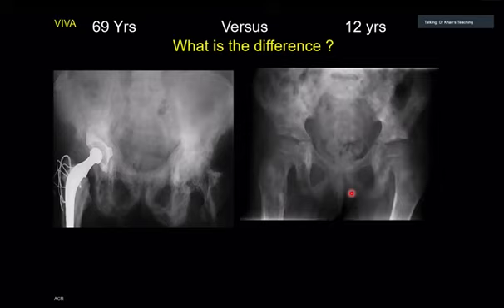So what is this? Fibrous dysplasia. Say again, please. Is it fibrous dysplasia? Anything else comes to your mind? So it's a child with increased patchy sclerosis. Okay, hint. What do you call this appearance?